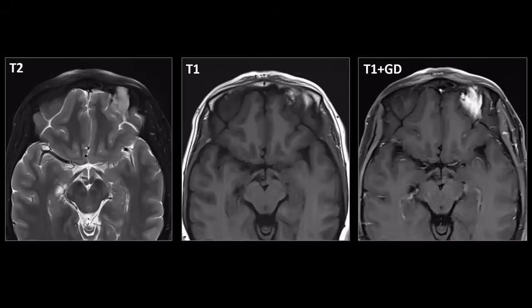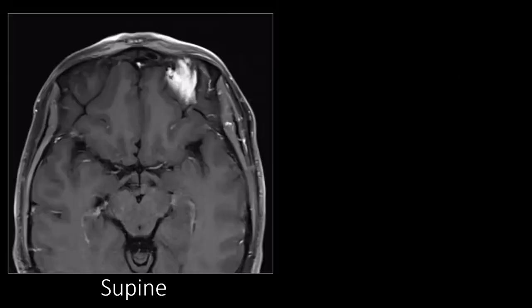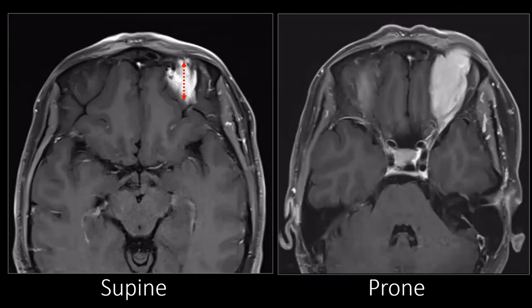What could this be? We already suspect them to be of a vascular nature, and then we did something special. Because the patient developed the proptosis when bending over, we performed an MRI with the patient supine, but we also did an MRI with the patient prone. And prone, we saw a significant volume increase of the lesion. And that is something that you will see in one specific condition, and that is a venous orbital varix.